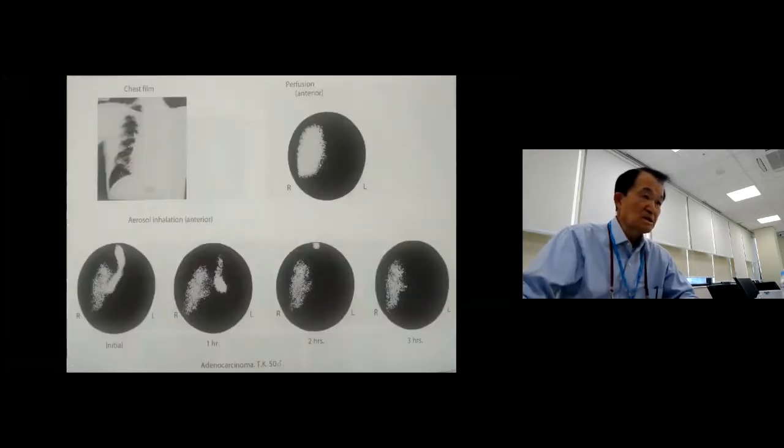Okay, when you see one lobe, it's mostly related to lung cancer obstructing the left main bronchus. So the bronchus is shut down, then V is down, nothing. Adenocarcinoma is usually peripheral, while central location is usually squamous cell. Adeno centrally is somehow unusual.